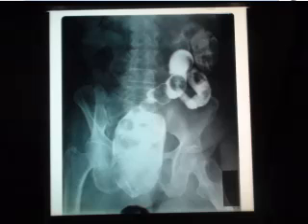To write a good description about this barium enema, you have to say that this is a barium enema showing multiple filling defects appearing here in the rectum and sigmoid colon. These filling defects are polyps. If the polyps are numerable and you can count them, it's mostly bilharzial polyps, like in this case. But if they are innumerable and you can't count them, like hundreds of polyps, it's mostly FAP or familial adenomatous polyposis. So for description of this case, you have multiple filling defects.